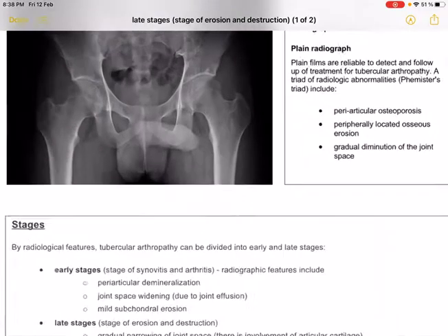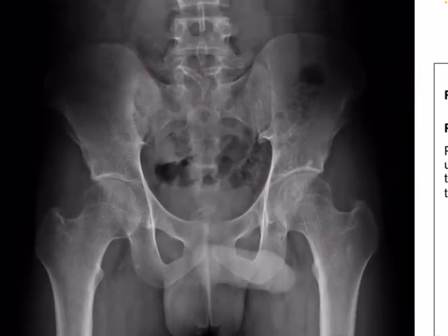In this condition, if we look, we cannot see symmetry on both sides of the body. The two sacroiliac joints are different from each other. In anatomy, we can see that the space between the two joints is markedly reduced on one side, and on the other side it is still normal. It will give you a clearer image if you perform the CT of the sacroiliac joint.